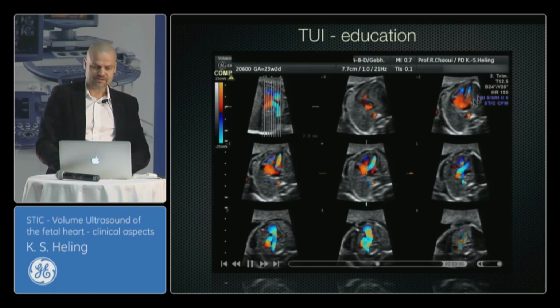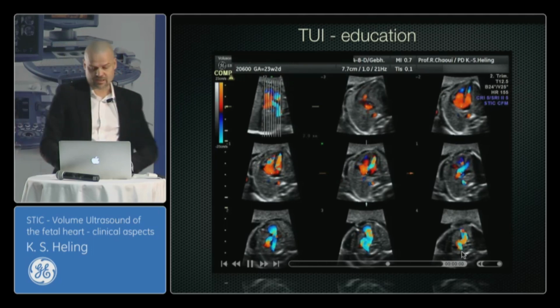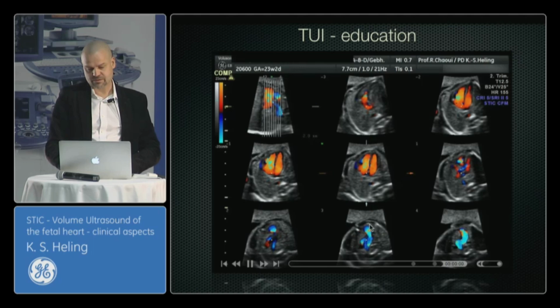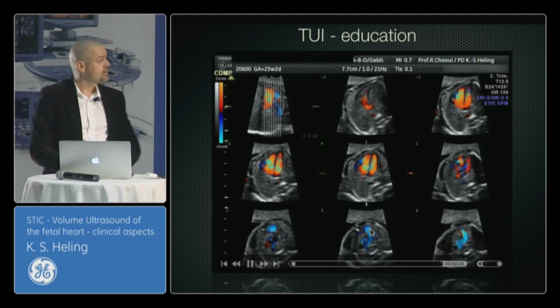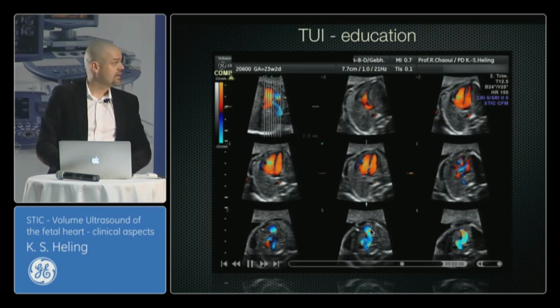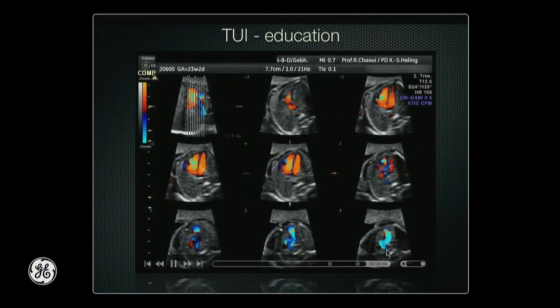If you look carefully, you see the apex of the heart is on the left side, but both arches are on the right side. So it's an isolated right-sided aortic and right-sided ductal arch, and the vessels are very close to the sternum, so there is no thymus there. It's a microdeletion 22q11, and right-sided aortic and ductal arch. So it's an example of a normal four-chamber view, but abnormal course of the great vessels. And in this image, you see all the typical features of these severe heart defects.